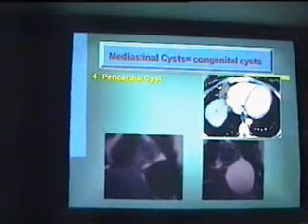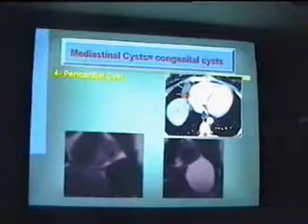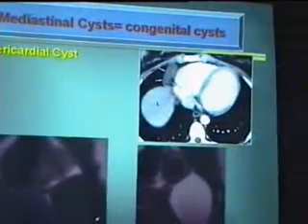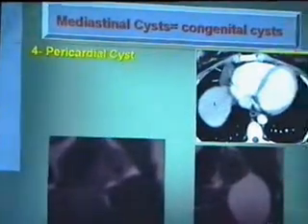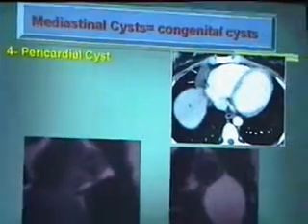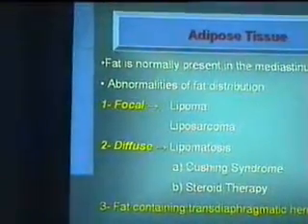وادي منظر البريكارديال سيست في الرايت كارديوفرينيك انجل اهي. اوكي؟ وادي المنظر على الام ار على تي 1 هايبو انتنس وعلى تي 2 هايبر انتنس and this is the part. هي البلورو بريكارديال برضه؟ زيها زي البلورو بريكارديال يس.